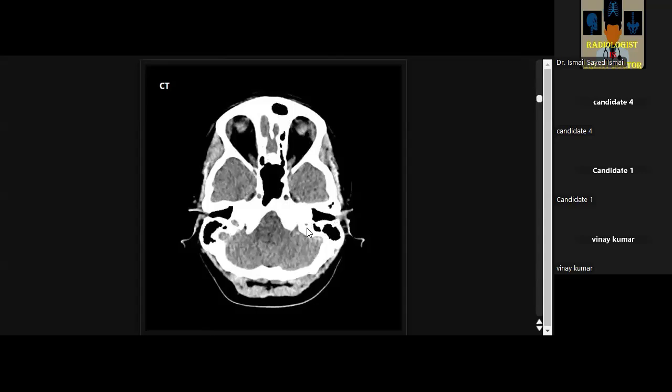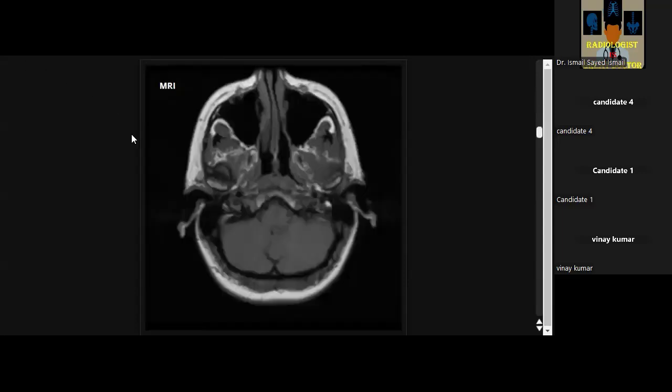Just leave the mouse. Okay. No, leave the mouse. Okay. Sorry, what do I do next? I should give up control, right? Yes, yes. Okay. And now you can scroll.